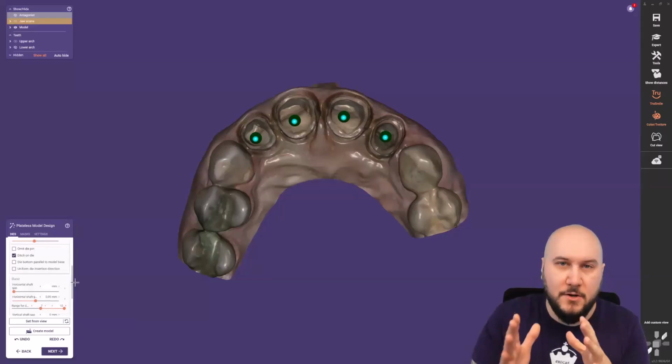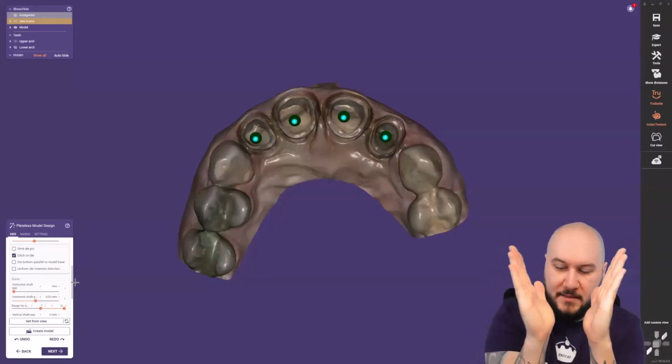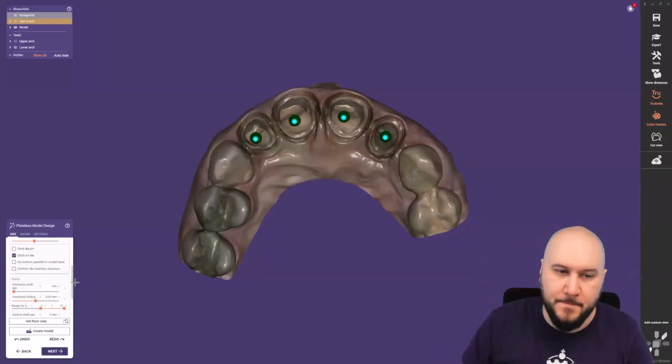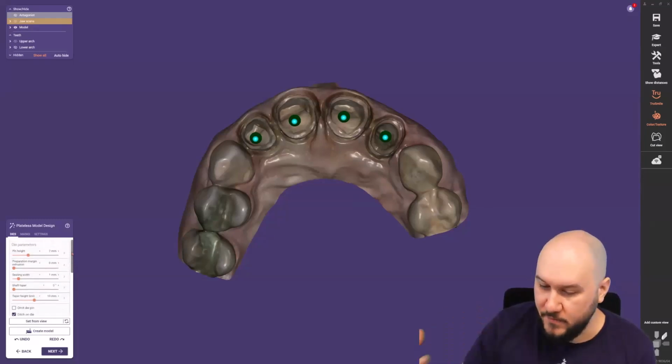Or you can also say use a dynamic shaft gap. If we go with a model alignment, a dynamic shaft gap, then you can also make them conical. It's also cool that you have slightly better fitting parameters for the different kinds of stumps or models that you want to use.